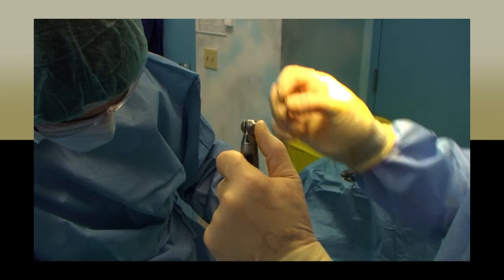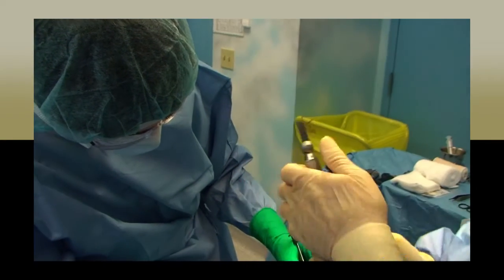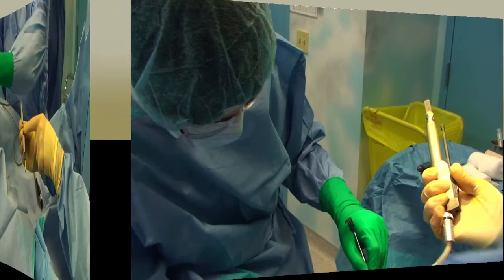This will open the head to show a set of teeth and grooves. The teeth will fit within the holes at the base of the blade, and when the button is released, the blade will set in place as the teeth move back into the grooves through the blade holes.